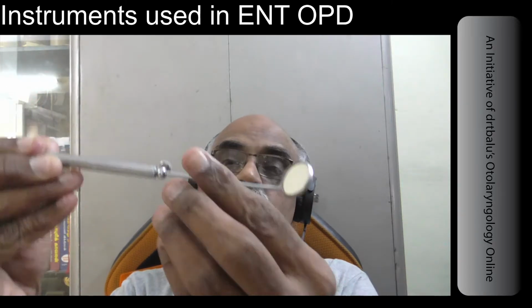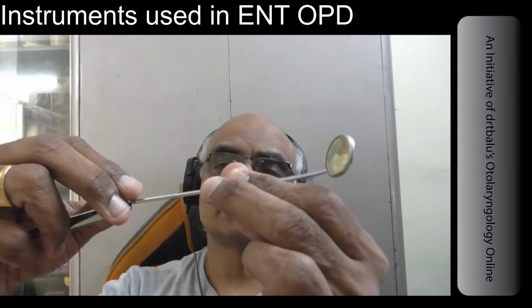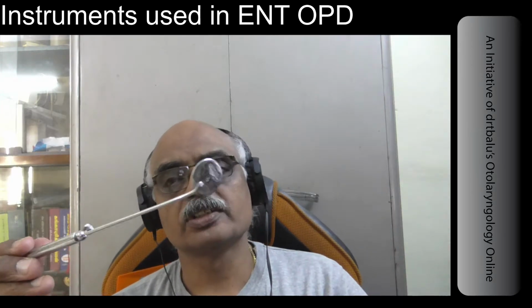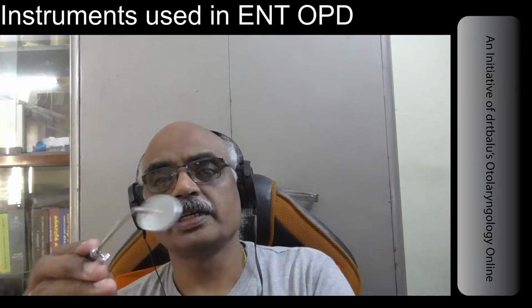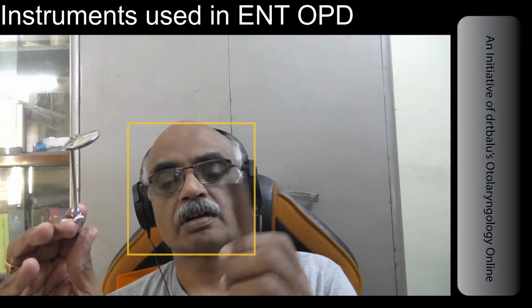The next instrument I am going to show you is Garcia's indirect laryngoscopic mirror. This is detachable. You can remove the handle from the mirror, and this mirror comes in three or four sizes. Depending on the size of the patient's throat, you can choose that mirror. This mirror can be held in your dominant hand, and then you use a tongue depressor, or you can ask the patient to protrude the tongue, hold the tongue between gauze, and gently slide this mirror just behind the posterior third of the tongue. Slowly you will be able to visualize the laryngeal inlet and the vocal cords.